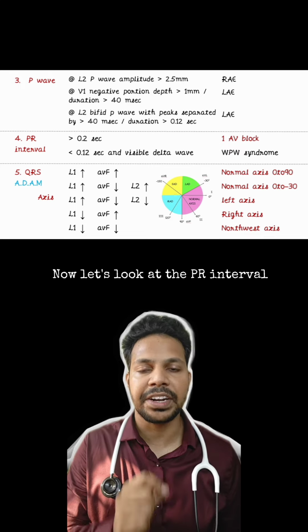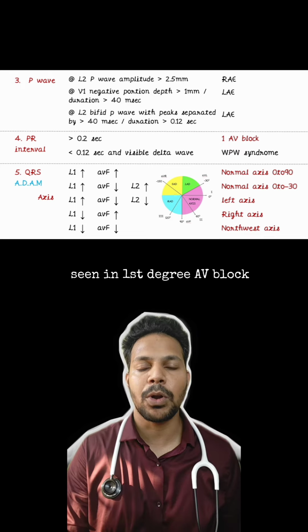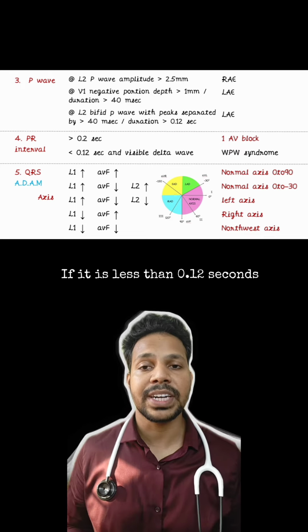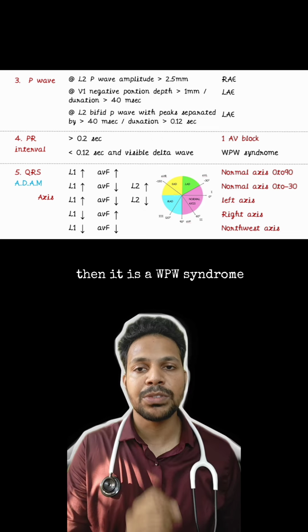Now let's look at the PR interval. If it is more than 0.2 seconds, then it is prolonged, seen in first degree AV block. If it is less than 0.12 seconds, then it is short, and if there is a visible delta wave, then it is WPW syndrome.